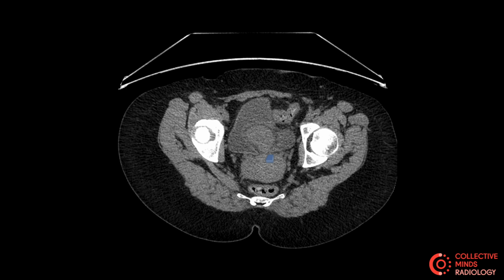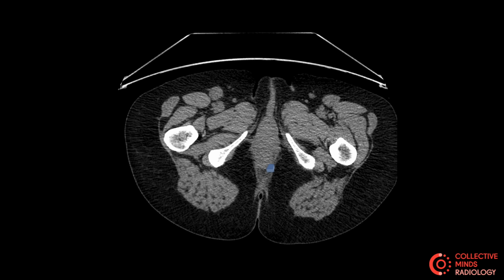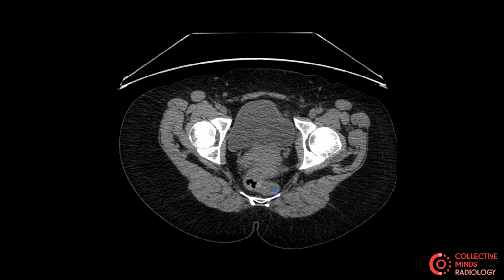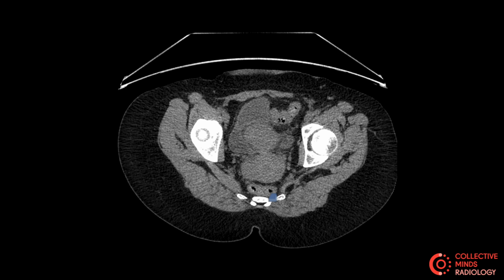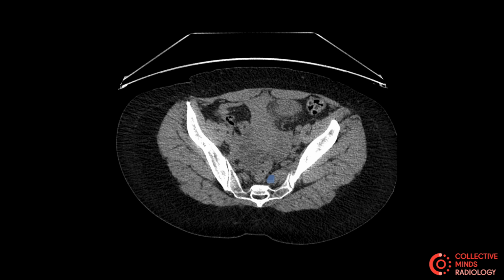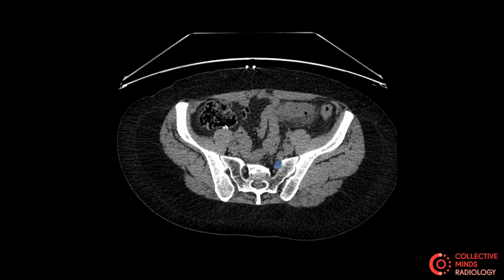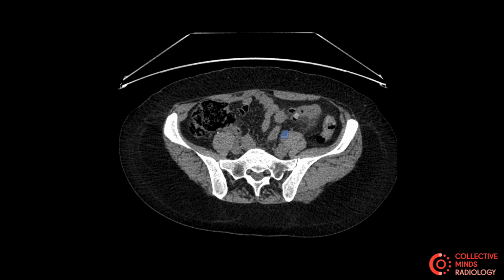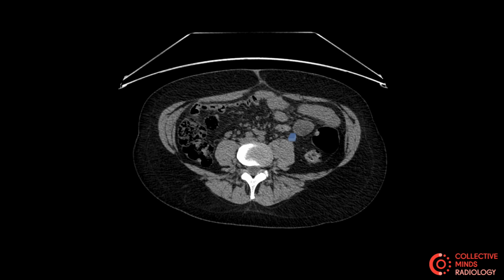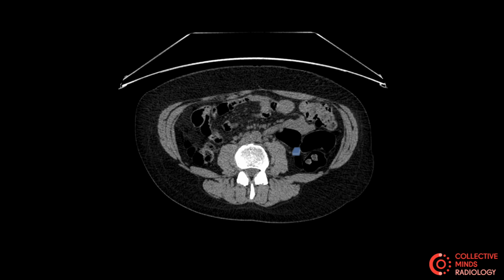So if we start from the rectum and then work our way up, we keep coming, and we can see the bowel, sigmoid colon, rectum. The sigmoid colon bends this way, goes anteriorly, goes this way, this way. And you really got to keep your eyes focused on the prize. You really got to try and see where you're going.